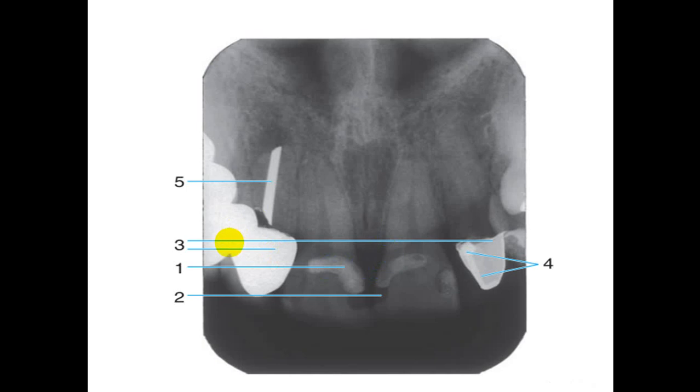هنا عندنا احنا نسميه over exposure of that radiograph.